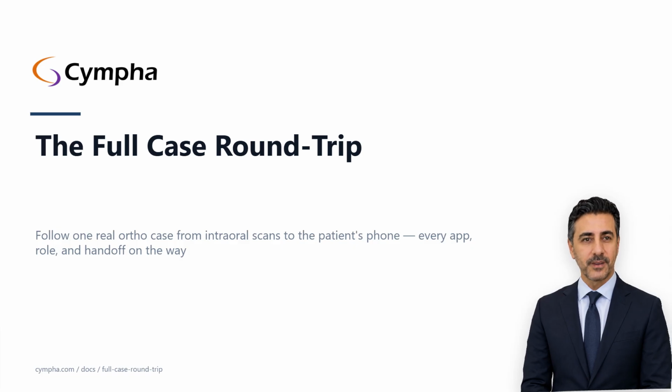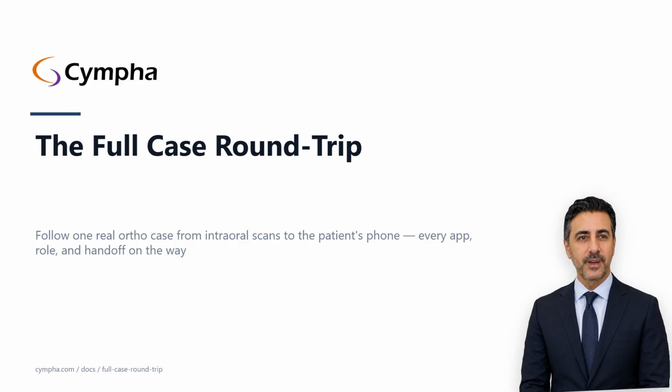By the end you'll know how a case goes from scans in Cympha Studio to a finalized plan in a patient's browser, and which app, which role, and which page is responsible for every single handoff. 9 steps, 4 parties, no gaps.